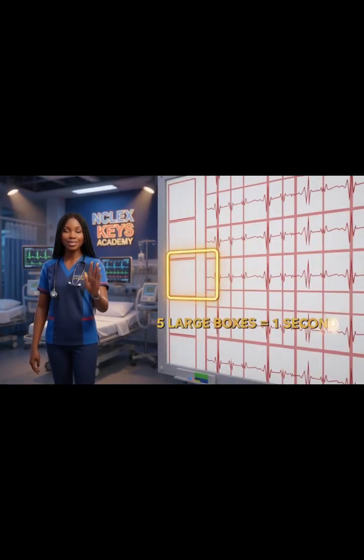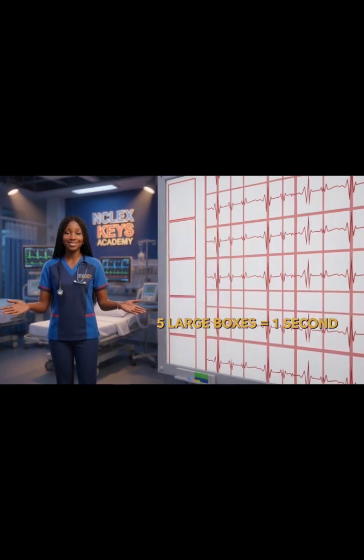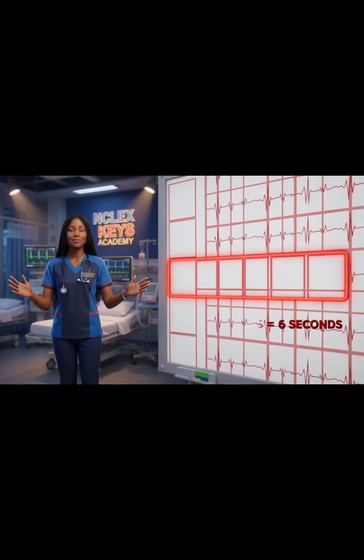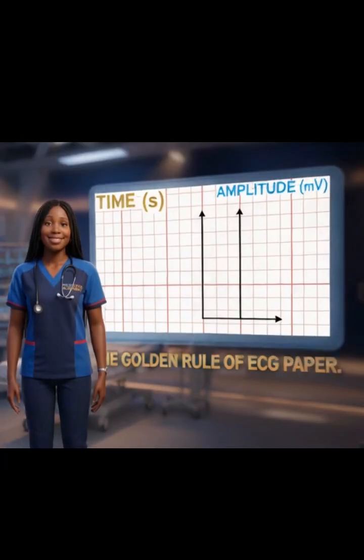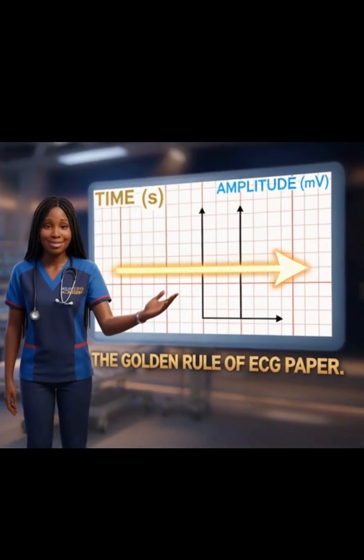5 large boxes equal 1 second. 30 large boxes equal 6 seconds. This is very important. Remember this for your NCLEX exam and for calculating heart rate. Always remember this important rule.